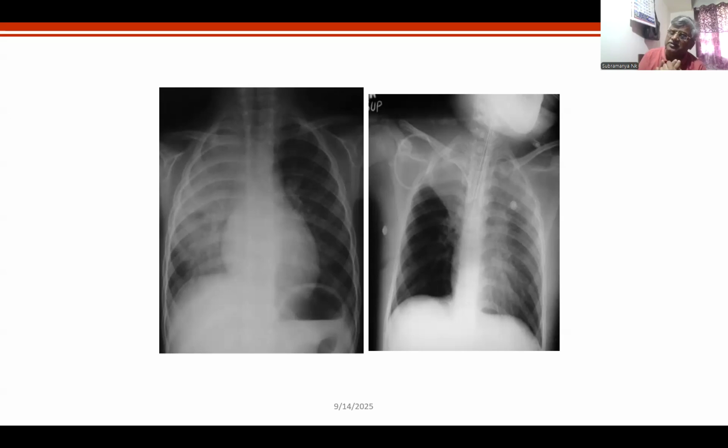If the upper lobe collapses, see, I will tell you, I can't see, Nagmani, I agree with you, there is no increased bronchovascular marks. I'm telling you the signs of collapse. It is not here, right? Crowding, no, I can't see bronchovascular markings here, Dr. Charul. I will just show you one of the increased bronchovascular markings a little later. Wait for me. Now here what I'm trying to show is there is loss of volume, there is compensatory hyperinflation, which is making me say collapse. There is a margin, right?